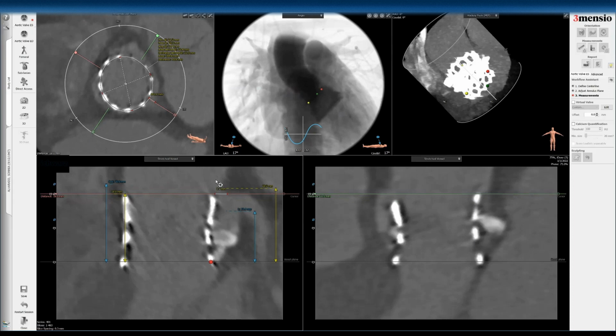And if you put a self-expanding valve up, which is supraannular, you'll need to definitely consider commissure alignment, because if you have a commissure post that faces the left main here, coronary access will be definitely more challenging than if the commissures are aligned. But here you can see the top of the transcatheter valve frame. After you put it in, it will be like a surgical valve, where this will now become a tube graft. So you want to make sure there's sufficient clearance here. People say at least 2 millimeters, but the more the merrier, obviously.